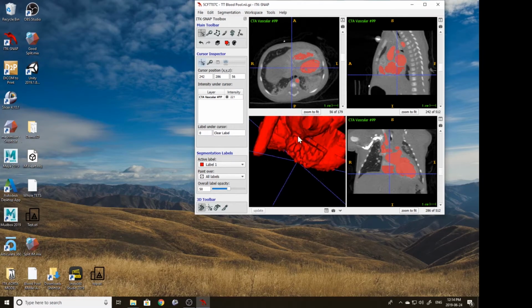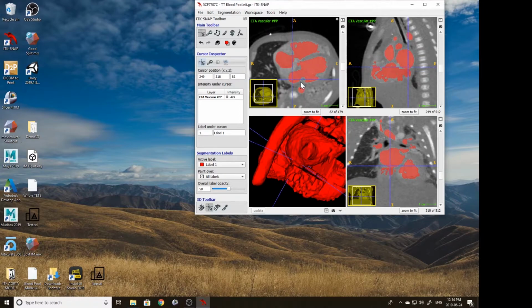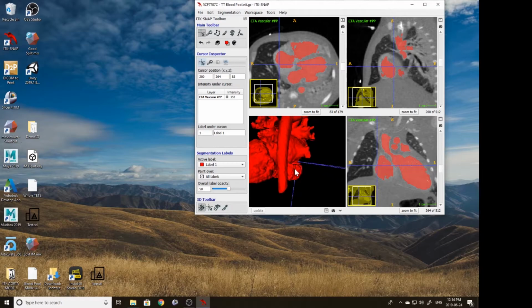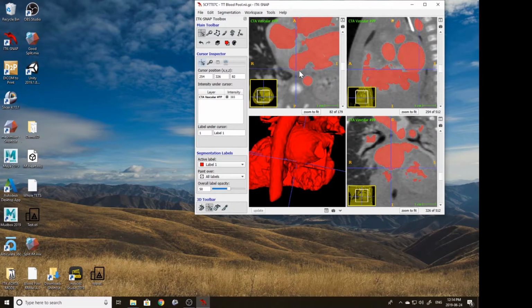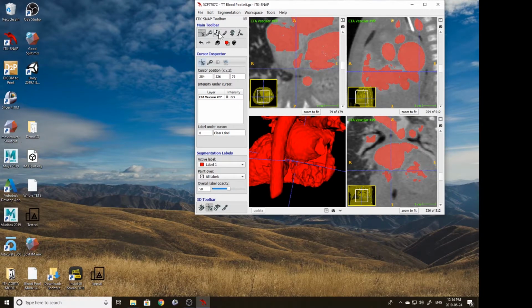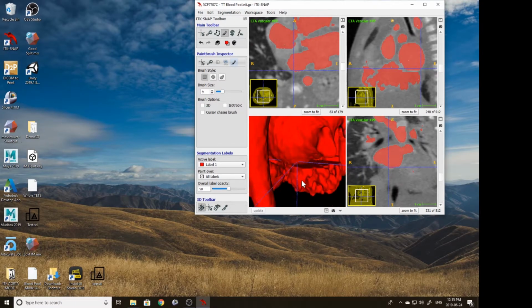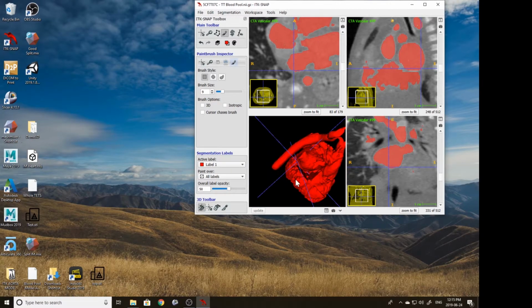Perfect. And we have a really low tolerance between those two pieces, between the atrium and those arteries. So two sides of the heart, there is not much room there at all. So that might, I forget exactly how I fixed that. I think I did a little bit of manual segmentation and really looking at the scans themselves and determining from the different contrast levels what was blood and what was muscle to then identify where those septums are so that I wasn't segmenting out the wrong places.